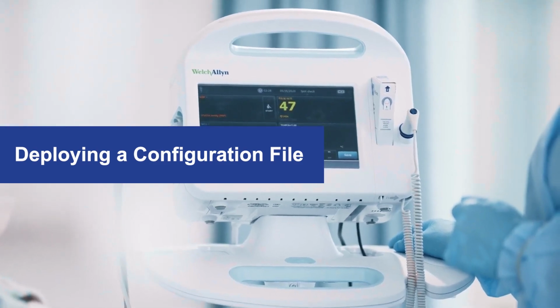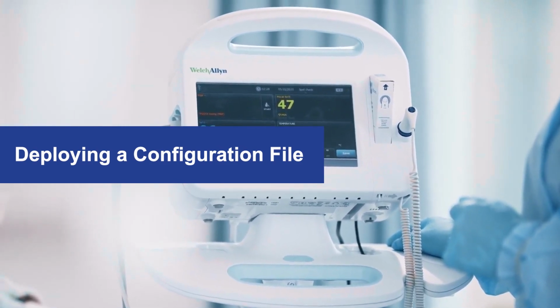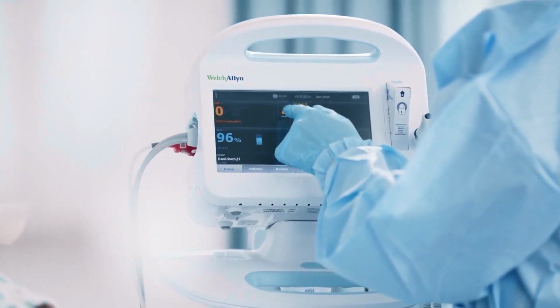For the Connex Spot Monitor and Connex Vital Signs Monitor, the platform enables you to deploy or push saved configuration files to one or more monitors in your facility. To complete a deployment, follow these steps.